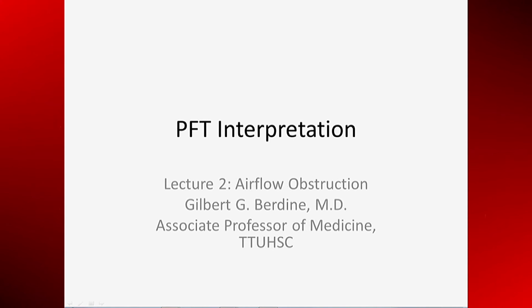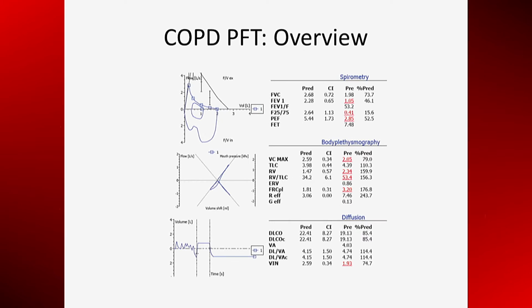Welcome to the second lecture on pulmonary function test interpretation. The first lecture covered a normal PFT. During this lecture, we will examine a patient with chronic obstructive pulmonary disease, or COPD. This is taken from an actual PFT performed at University Medical Center in Lubbock, Texas.